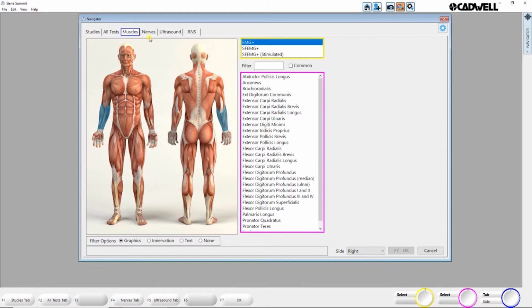On top of that, in NCS Plus, we use the anatomy database to set up your tests. So you'll have a database of access points, which are stim sites or recording sites associated with different nerves to set up your test setup. That allows us to set up reference values for specific anatomical locations so that when you do a test that has the nerve with the appropriate access point, you can have a reference value set up for that particular site.